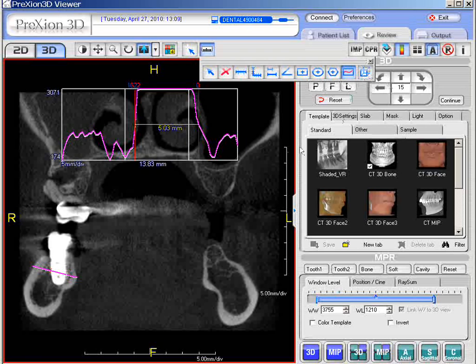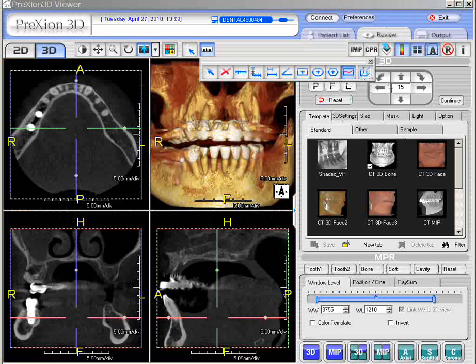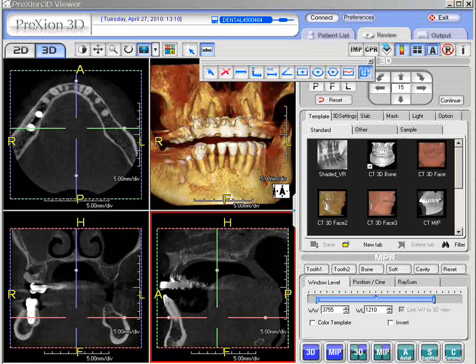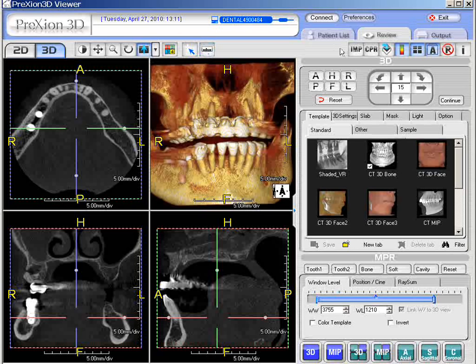Now the cube view here, we can basically ignore the 3D cube view. Even though we activate it, it doesn't really have a function here, so it's not necessary to even activate it. So kind of ignore it, if you will. Remember that this Prexion software was adapted from medical software, so some items have transferred over from the medical grade software, and this is one of those features. To simply close out the toolbar, just click on the toolbar icon itself, and your measurement toolbar will go away.